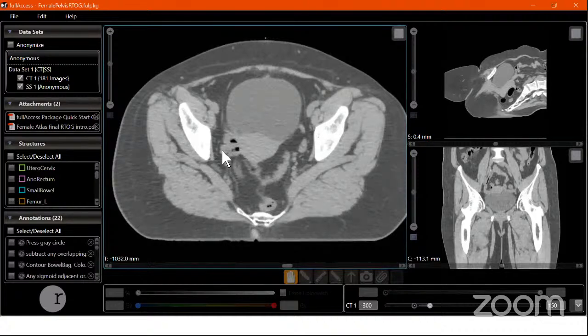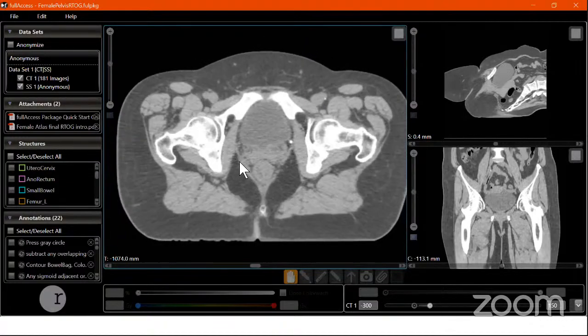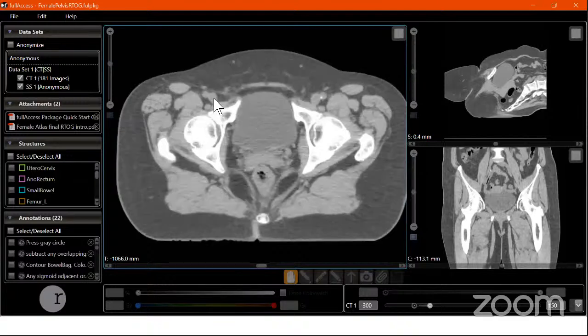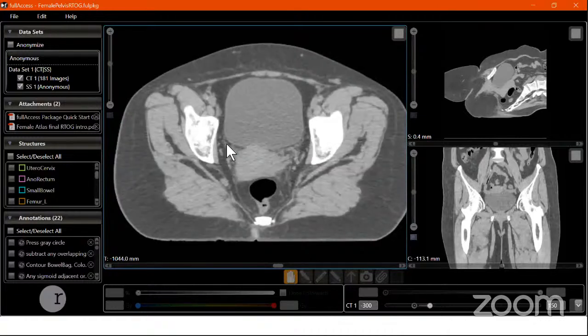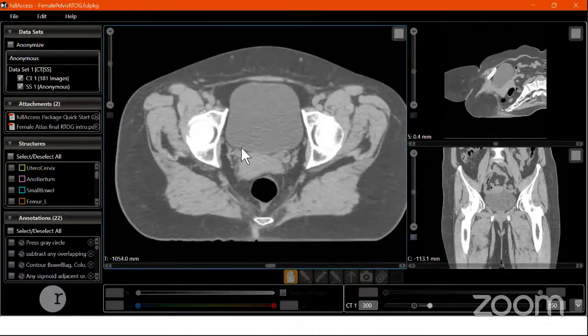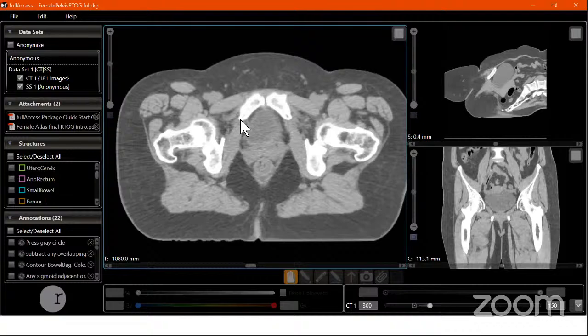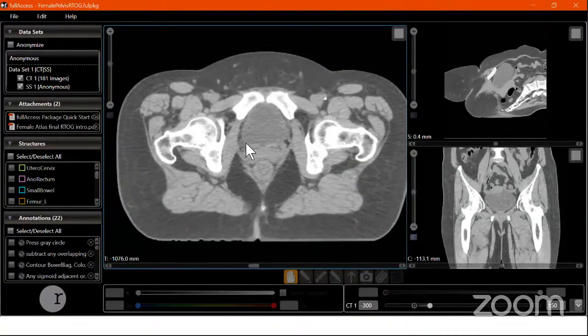So what is the lowermost part of the obturator contours? So we come down, and the lowermost part is going to stop at the moment the external iliac disappears. So at this level, we don't continue it. And then the obturator nodes ideally come down surrounding the internal iliac group right up to the place where we get the obturator foramen. Once the obturator foramen appears, we stop contouring for the obturator node.